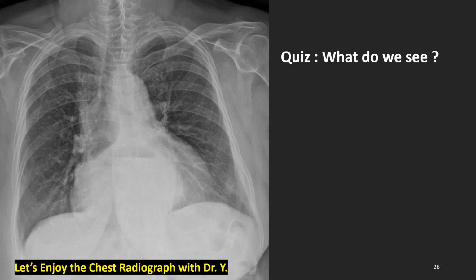This is the last slide and quiz for the next session. She's an old woman, with no difficulty, no symptoms. What is the diagnosis, or just what is the finding?